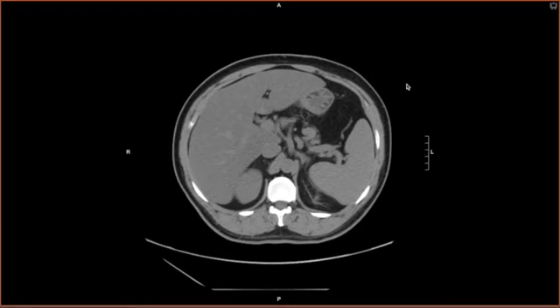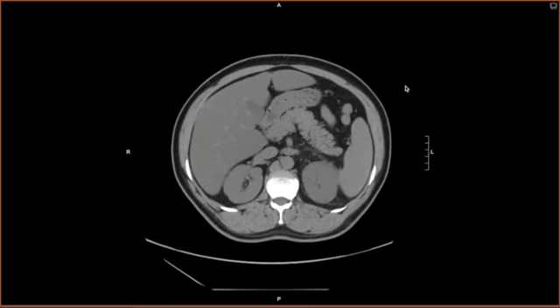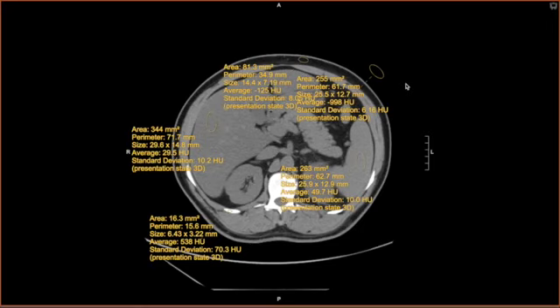And just to show you some of these densities in number format like we've been looking at, I've put an ROI, or a region of interest, marker on some of these areas. What that does is it averages the density, or the Hounsfield unit number, within that particular selected area. So we'll start here. In the upper right corner of the image, I've selected an area outside the patient, which is air, which we said by convention is about -1,000. So here if you look at the average number, that's what we're looking at. And so that shows -998.